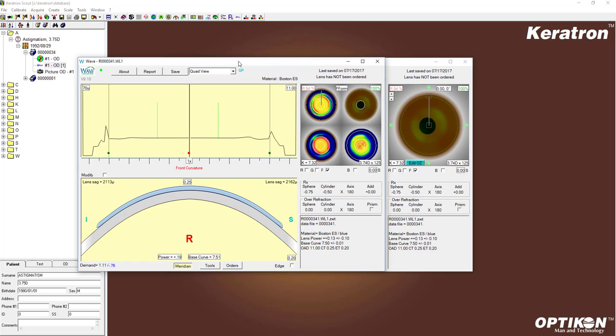And if you notice in the quad view, up at the top, there's a click to toggle between using freeform or GSYM corneal data for Flourescein and tear layer graph. This was put in back on version 8.10. And the reason why it was done is because customers wanted to be able to, while they were designing the lens, toggle back and forth to see the difference in freeform and GSYM.